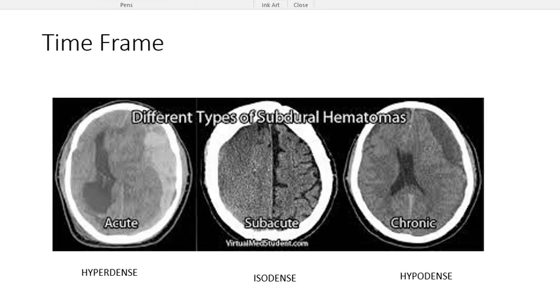And perhaps what I want to add here is that subdural hematomas can either be acute, subacute, or chronic. Acute blood shows up as hyperdense. That's what you're seeing as a white discoloration, the hyperdensity you're seeing there. As time goes by, the enzymes will start digesting this, and so it starts mimicking the normal brain. You can't even tell the normal brain from the bleed anymore, so I call it isodense.